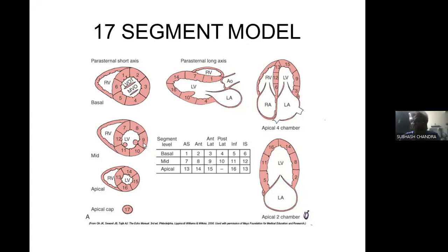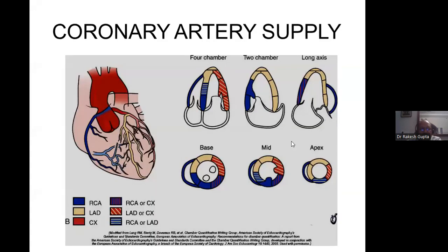So when you come here, you could either be looking at the right coronary artery or you could be looking at the circumflex. I think Nandita, the best answer is to go to 4-chamber, 3-chamber, and 2-chamber. Let's go back to the 4-chamber. Go back to the previous image. If you look at this 4-chamber, 2-chamber, and 3-chamber, these parts, just keep on marking them.